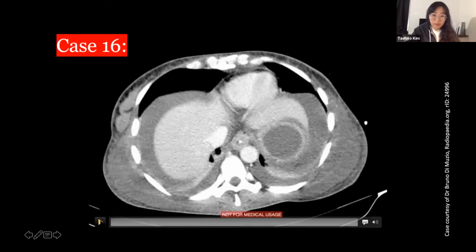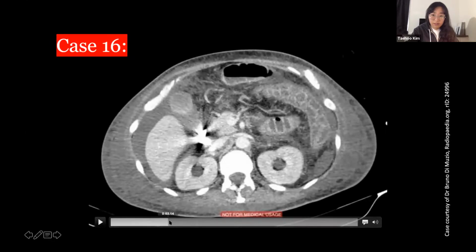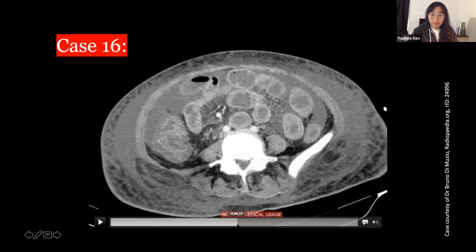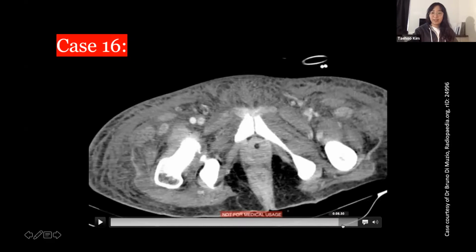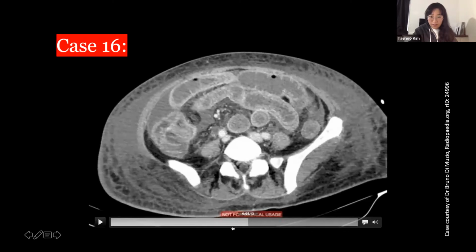I forgot what this one was. Oh, yes. Okay. So you can see that it's a very ugly looking scan, right? What I mean by that is, first of all, look at the outside skin. You see this is very bright, dirty. That's from the edema, and that's what we call generalized anasarca.